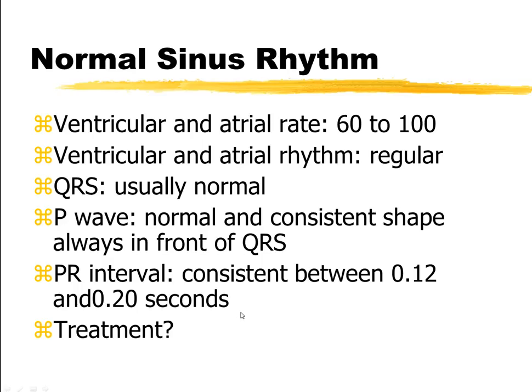Let's jump right in now to identifying the rhythms, and we'll go through that same pattern like I mentioned before, and I'm going to bold on the slide the key element that you should really focus on in order to identify that particular rhythm. Now we're going to start with the easy one, normal sinus rhythm. I think it's important to start with that so you know what normal looks like.